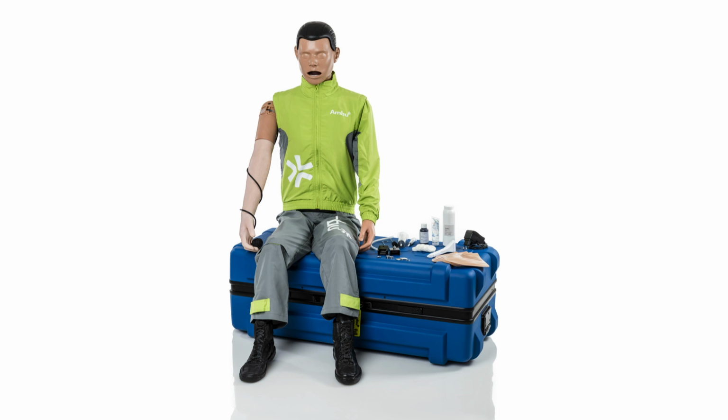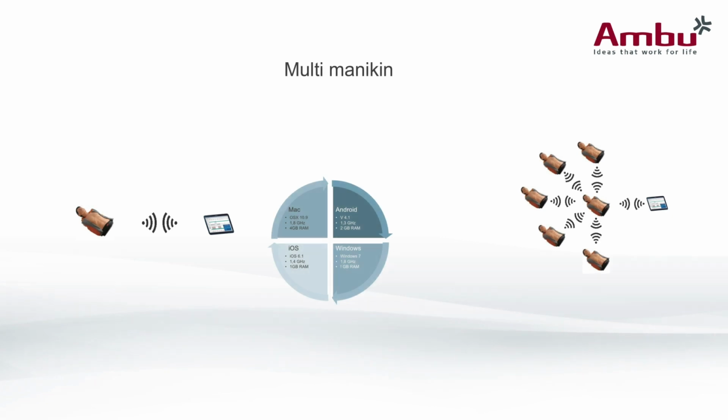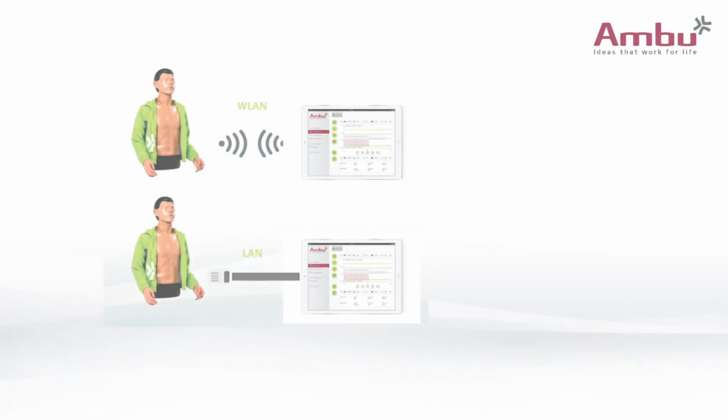The manikin is scenario-driven, where each instructor can be creative and develop custom scenarios for ALS CPR training. With AmbuMan Advanced, you can perform multi-manikin, connecting up to 6 manikins at a time to run your scenarios. AmbuMan Advanced has separate instructor and trainee views. It also has a built-in 32 gig hard drive to store all of your training data. The instructor and several trainees or viewers can be connected to view the training at one time.